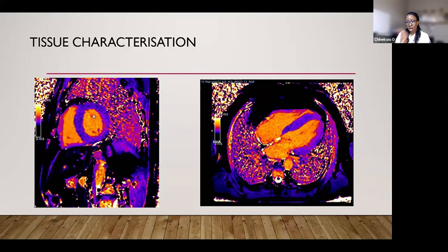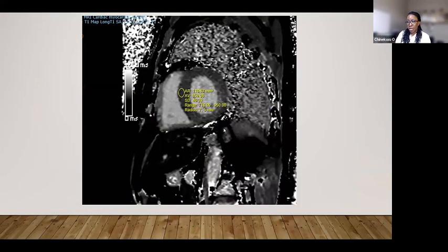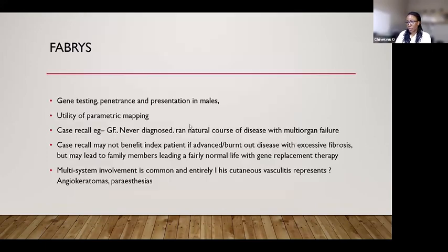So we were able, on this cardiac MRI, to say that his diagnosis was Fabry's disease. Yeah, 859. We're able to say that it's Fabry's disease and basically referred him to the Lysosomal Storage Diseases Center at University College London, where he's there having an enzyme replacement therapy.